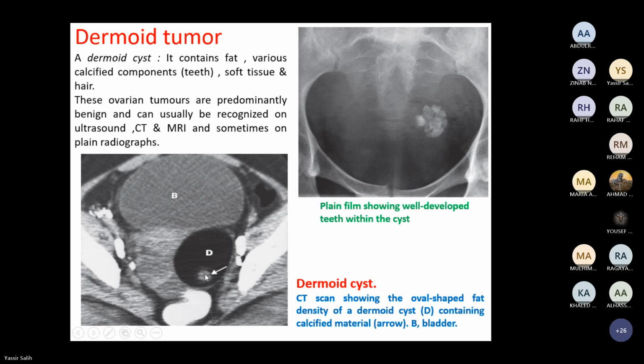Over. So this is all dermoid. Yeah, this is a calcification. So this is a calcification and this is fat, but this is a dermoid cyst. This CT demonstrates the dermoid cyst. We know the components that are clearly visible: the calcification and the fat.